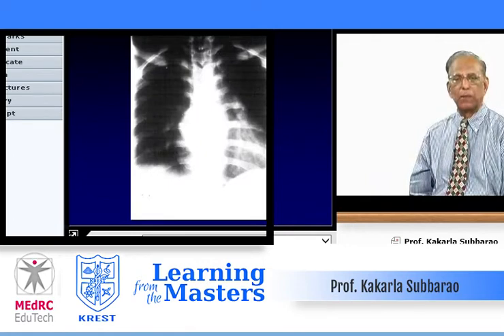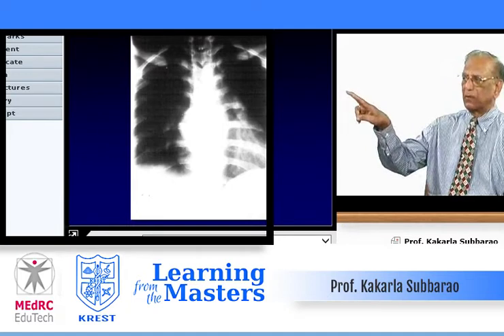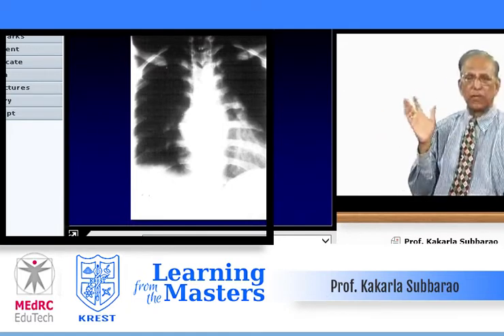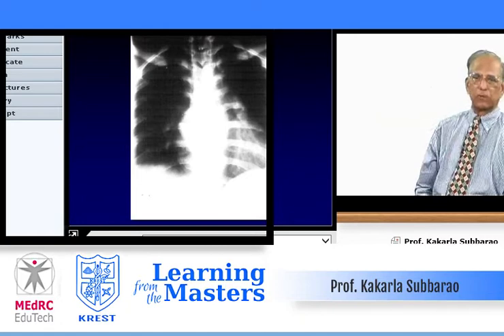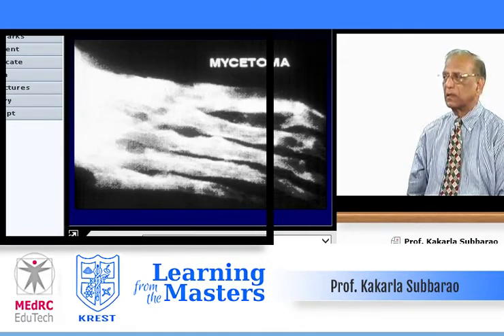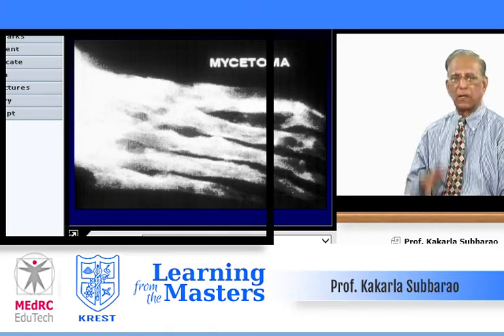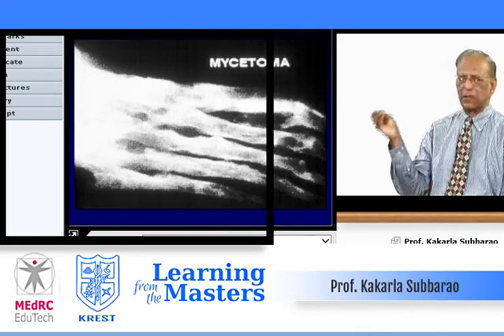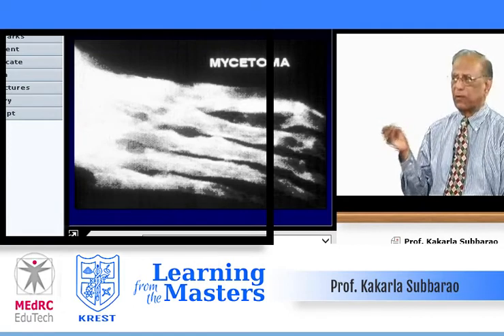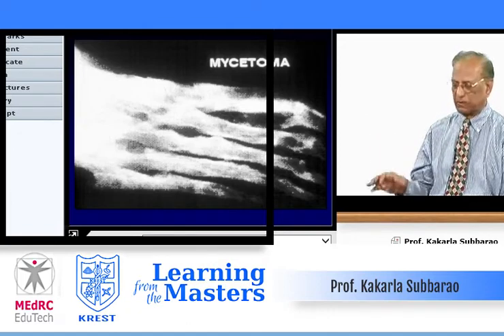Sudden pain in the back and paraparesis symptoms: on AP view, bilateral paravertebral soft tissue swelling. Unless you take a lateral view, you can't diagnose it as tuberculosis of the spine. This is not so much an emergency, but it's commonly encountered in rural areas. Chronic fungal infection, either actinomycosis or nocardiosis, or a combination of organisms. There is the classical chronic osteomyelitis, periostitis, irregular cortical thickening, multiple sinuses: mycetoma of the foot, or so-called Madura foot.